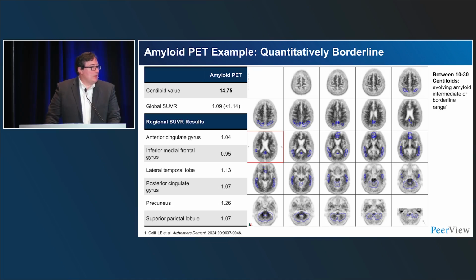Most people would say this is abnormal amyloid pathology based on deposition based on Centiloids. I would read this as visually positive, but not be very happy about it because it is a borderline case. But the Centiloid here matches my visual interpretation.